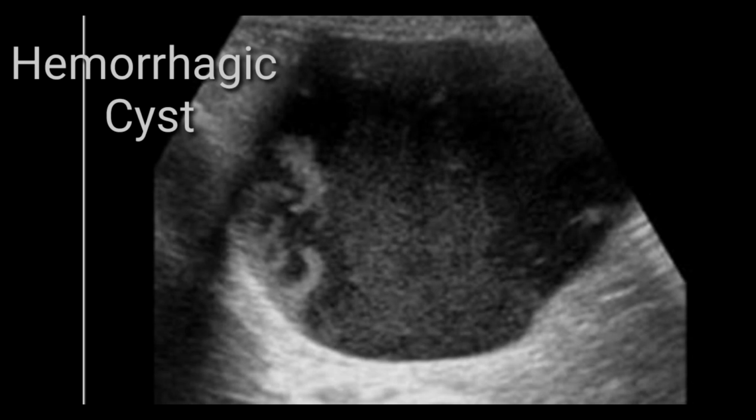In case of any complexity, the first possibility is that you ask the patient for a follow-up scan within 4 to 6 weeks post therapy. So the patient would take the medicine, again she will be sent back to you, and you just look to see if the cyst is regressing. If that is okay, you can give a follow-up scan after 4 weeks, again 4 weeks, to look for complete resolution.